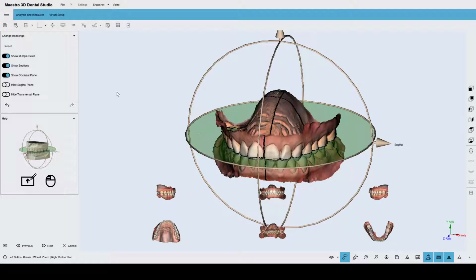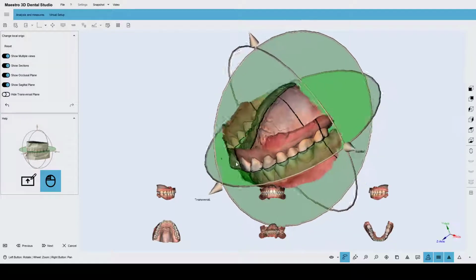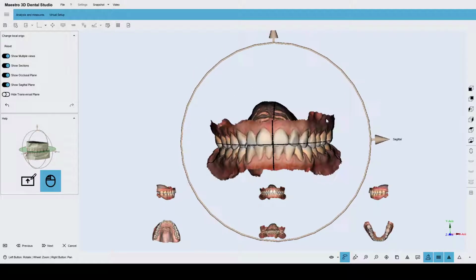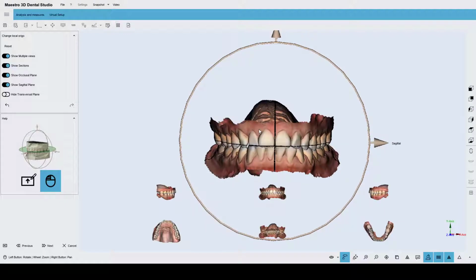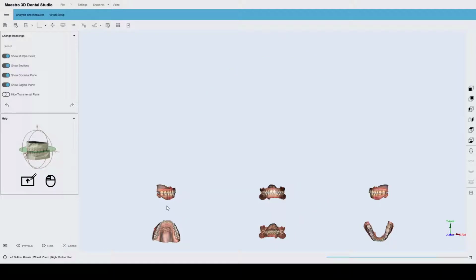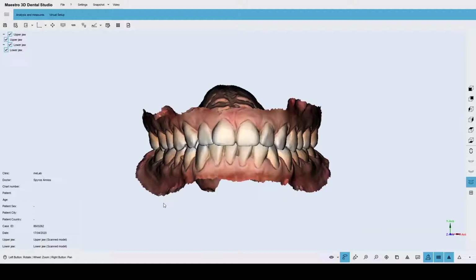available on the screen. You can see here that we can also show or hide other graphical elements in order to better evaluate the positioning of the models. This step is really important because everything we will do in the upcoming steps will be made according to the axis defined here. Supposing that we are happy with the positioning, we can proceed and start now the job.